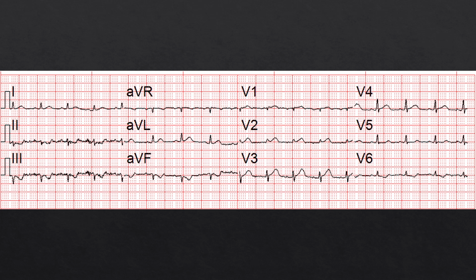So another issue with hyperacute T waves is if they're big and tall and symmetric, like you've seen in some of those previous slides, you notice, okay, those are obvious. They jump out at me, right? That's easy. You probably already knew that. But remember, it's a ratio compared to that preceding QRS. So if you look here, this is another case.